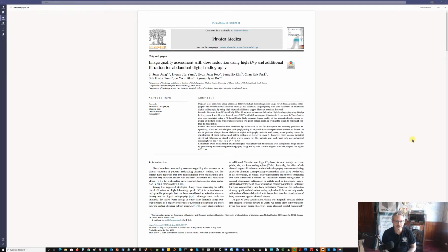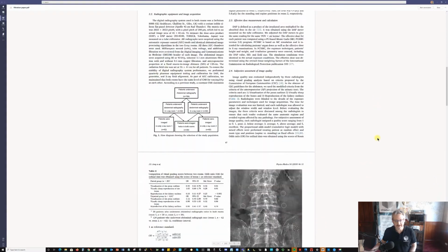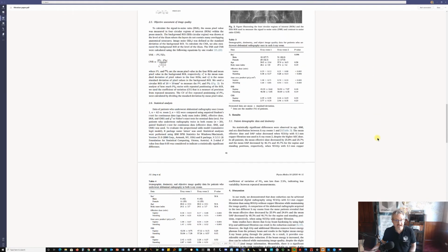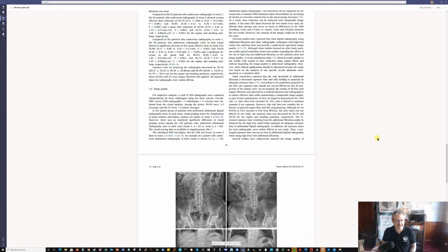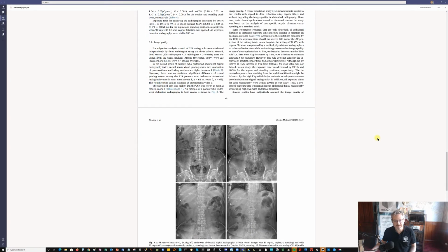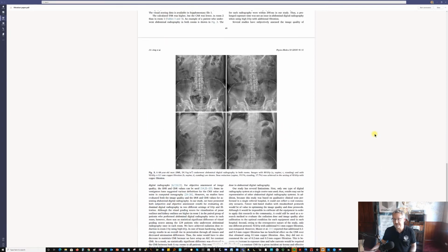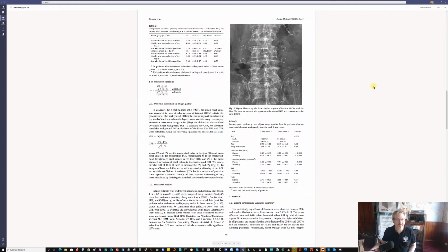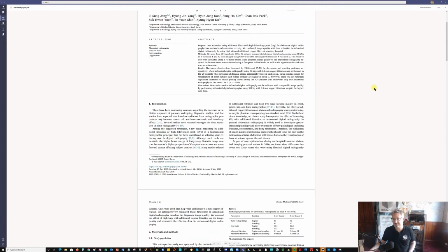One of the ways that interested them was the use of copper filters. So we took this paper and read it, and looked at how they'd done the experiment. They were looking at abdominal x-rays, and we reproduced that as best we could using ProjectionVR. We took some abdominal x-rays, dose measurements, and image quality measurements. I'm going to show you how that was done as an example of what you can use ProjectionVR for in some of the more technical aspects of the course.